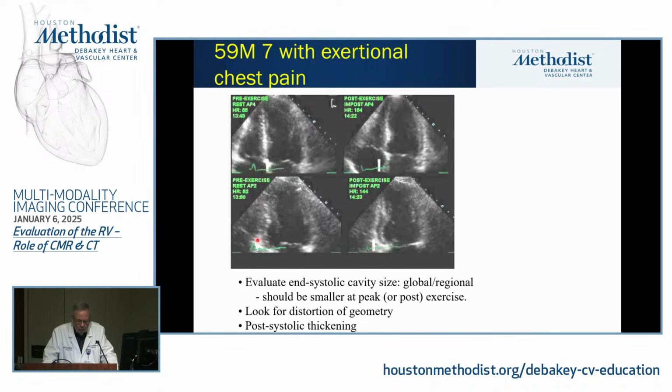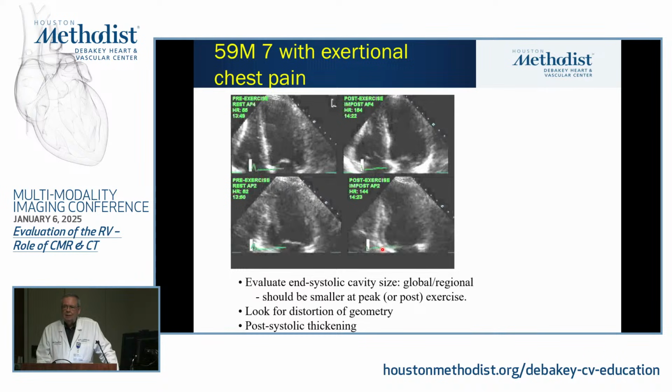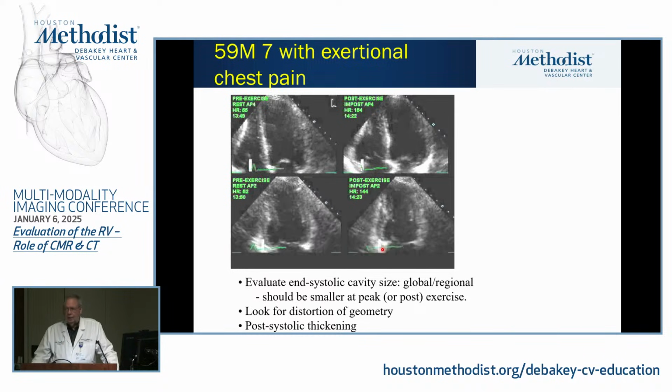Look at how this is thickening. Now, what about this one? Is it thickening? Yes. But look at the mitral valve. Now, now, now, now. What is this? This is a classic example of post-systolic thickening.